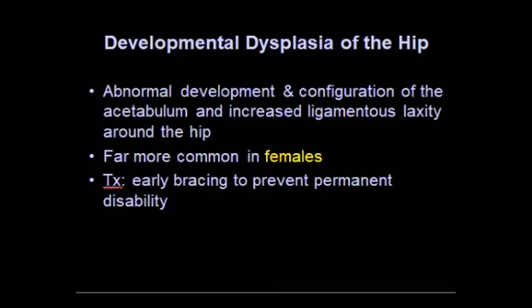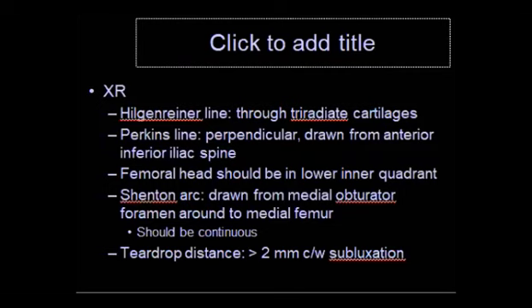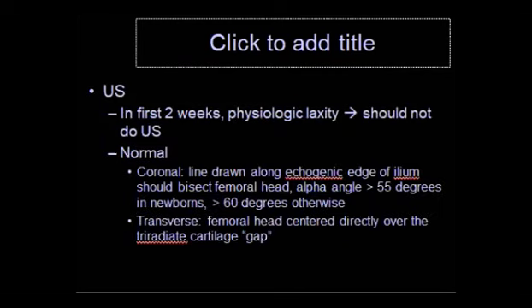The differential will be, I think, the developmental dysplasia of the hip. So we already mentioned the lines. If you remember from our session, the acetabular angles increased in which syndrome we just mentioned? When it increased, it was increased in which type? Mucopolysaccharidosis. Yeah, nice. Thank you.